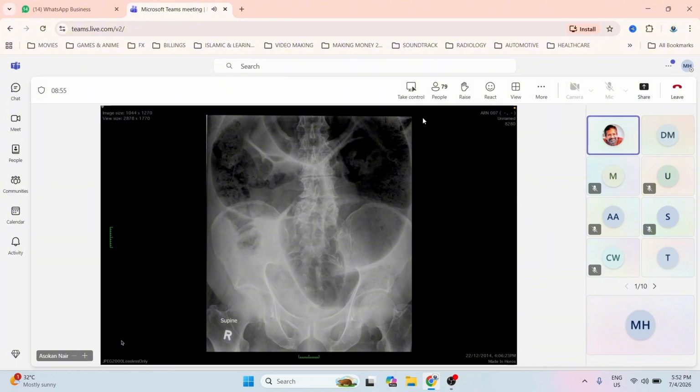Okay, and then what else do you say? Just think of the textbook. What do they say about sigmoid volvulus? Coffee bean appearance. Why don't you say that? It's a nice coffee bean there staring at you. I mentioned earlier. You mentioned, is it? Okay, sorry, maybe I didn't hear you so clearly.